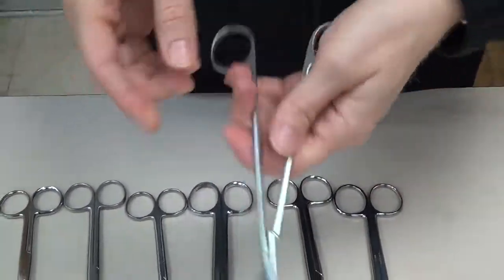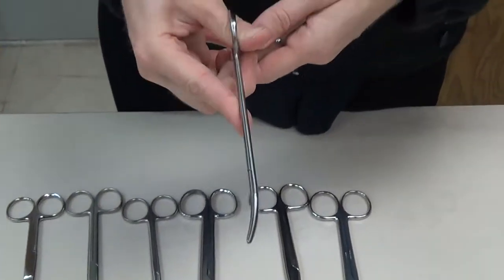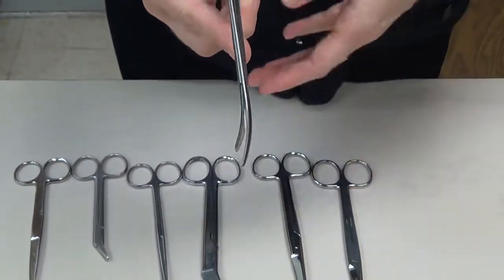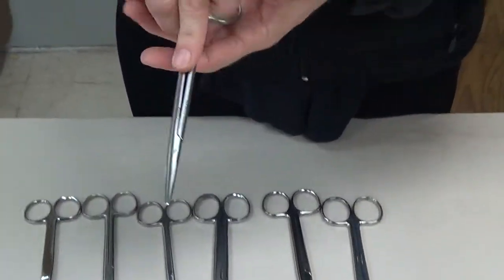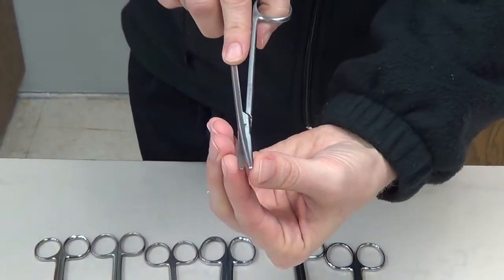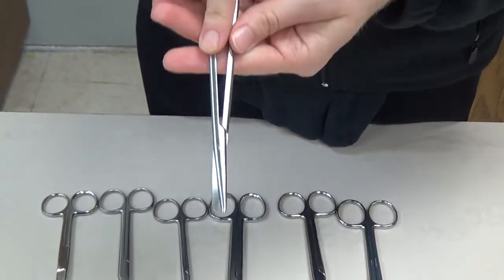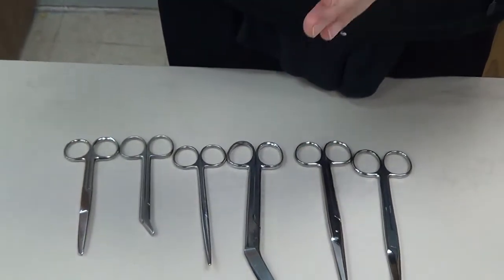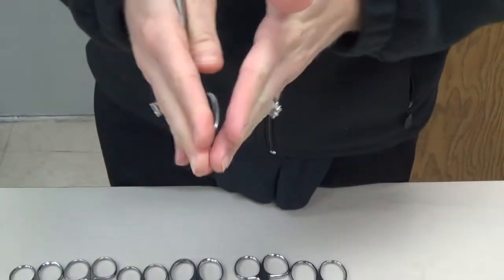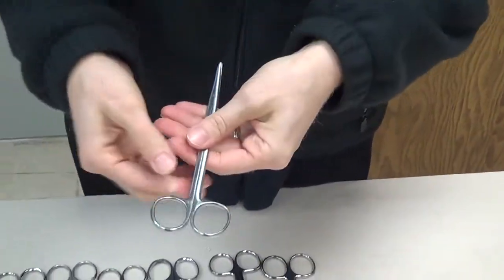When we use a scissor, we can use it one of two ways. For sharp dissection, they'll tend to turn it to the side and actually cut, like you're very familiar with using a scissor, like you would cut a piece of paper. Or they can take the blades and really use the outside portion of the blade, stick it between the tissue and kind of open it up. And that's called blunt dissection. And what that does is it just uses the body's natural tissue planes and dissects down through the tissue to expose the various different structures.